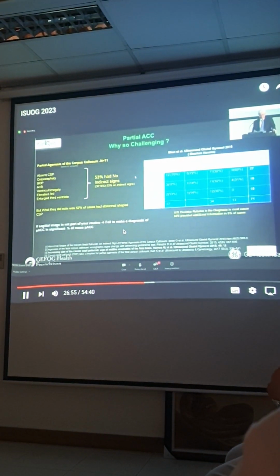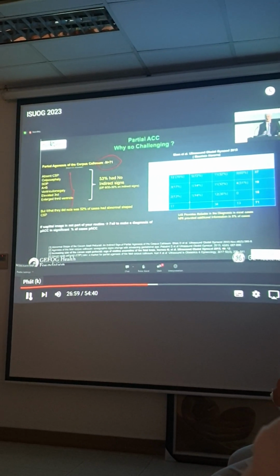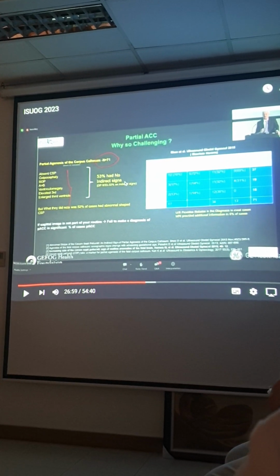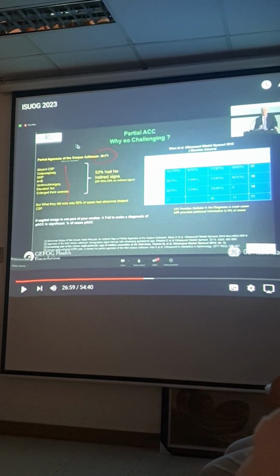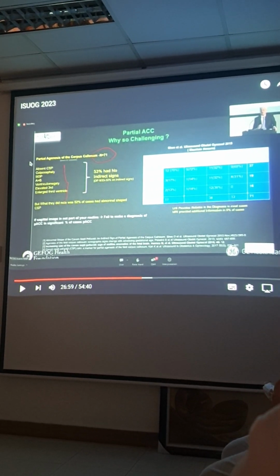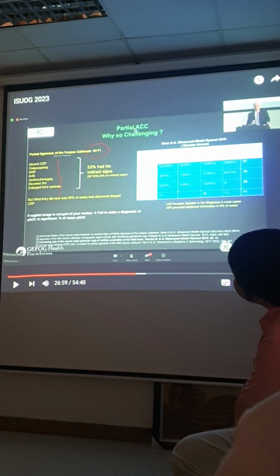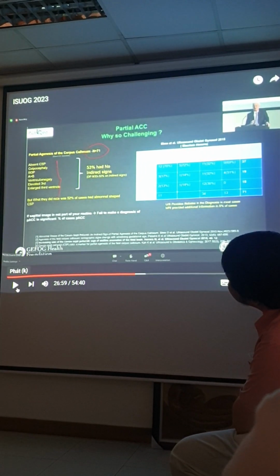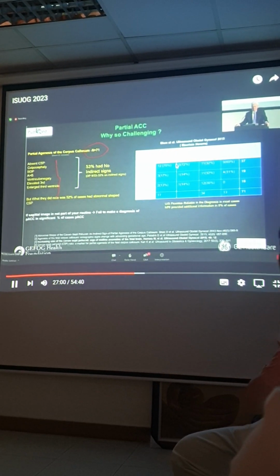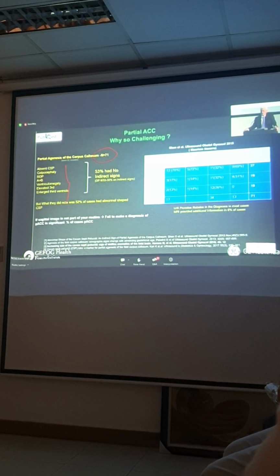This is a study of 71 cases of partial agenesis and they looked at all the signs. Và các bạn thấy nè, 53% không có những cái dấu indirect sign, tức là những cái dấu trên mặt cắt ngang, mà nó là trên mặt cắt ngang mà nó có những cái dấu điển hình như nãy giờ ông nói về cái thể hoàn toàn thì cái dấu này nó hoàn toàn không có, đến một nửa luôn. And the depressing news is the majority of them had no indirect signs.